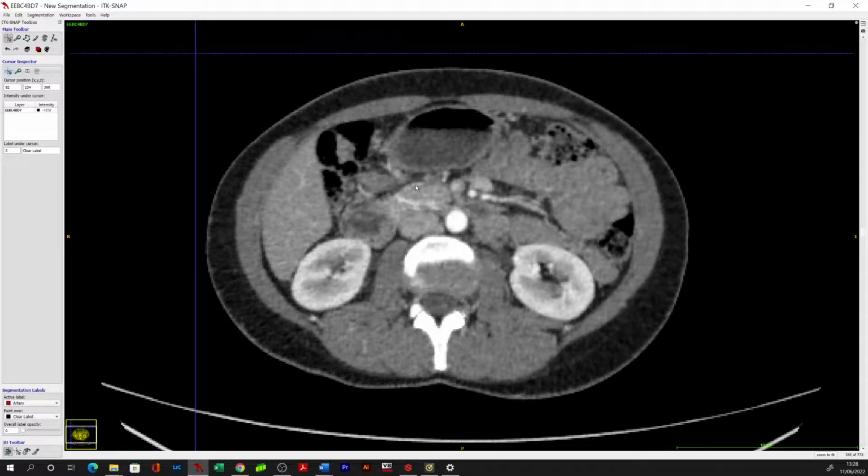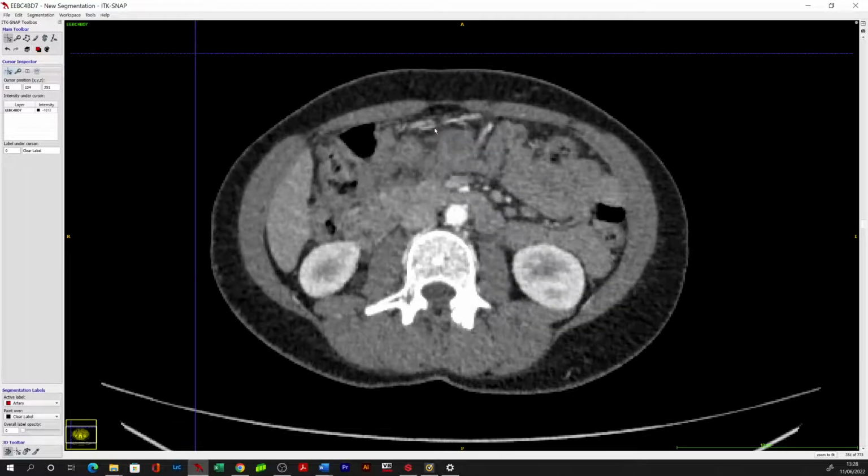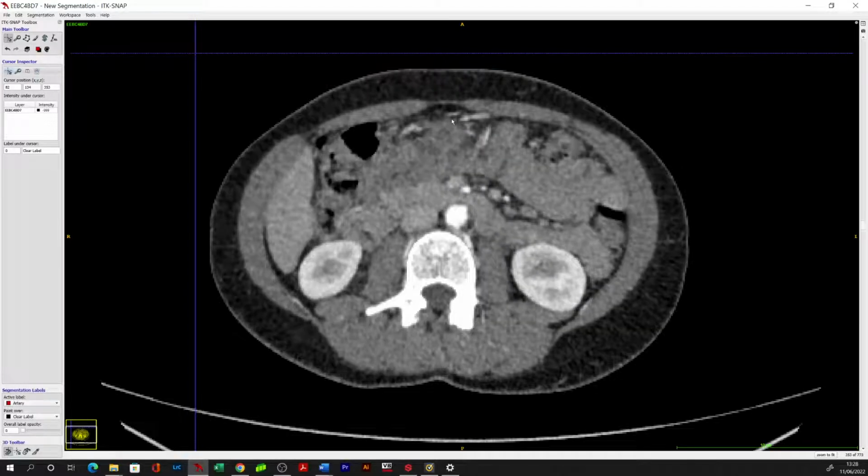If we follow one of these vessels. So again, I think this is where it is useful to try and grasp things which are more evident. So we know that the GEV is going to be coursing along the stomach, which we can visualize here. And we can see that there's a vessel that's running along the lower aspect, or the greater curvature, of the stomach. So this is likely going to be GEV.